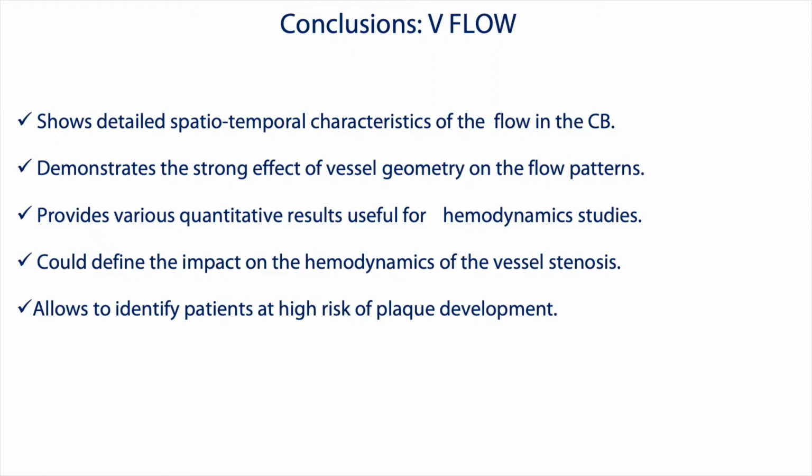Based on what we have seen, let me come to some conclusions. The flow shows detailed spatiotemporal characteristics of the flow in the carotid bifurcation and demonstrates the strong effect of vessel geometry on the flow patterns. It provides various quantitative results useful for hemodynamic studies and could define the impact on the hemodynamics of the vessel stenosis. And last, the flow allows to identify patients at high risk of plaque development.